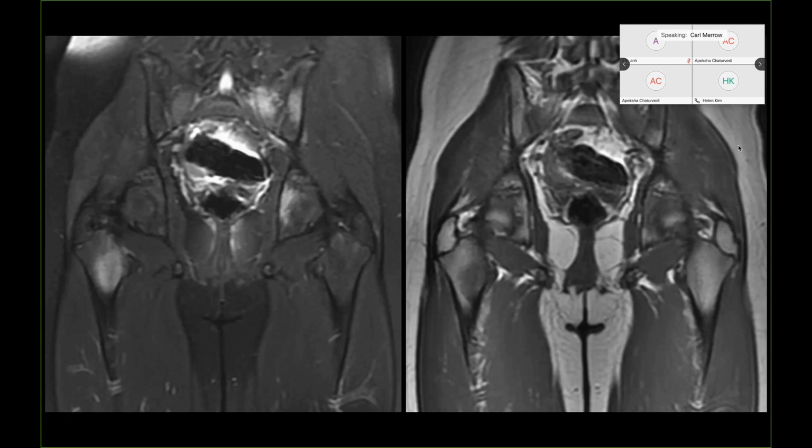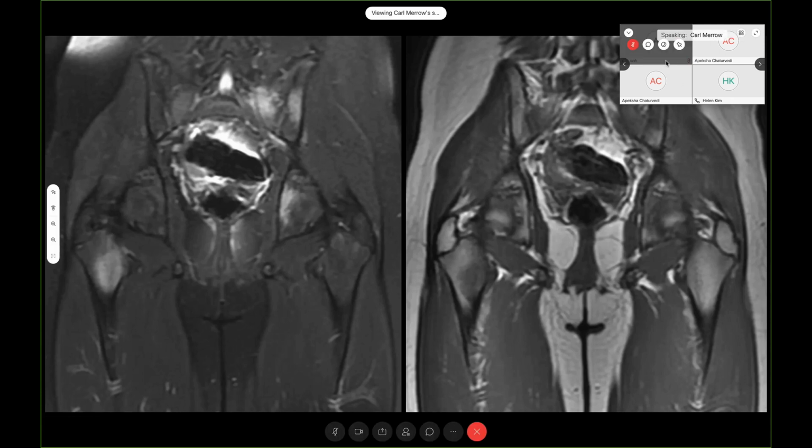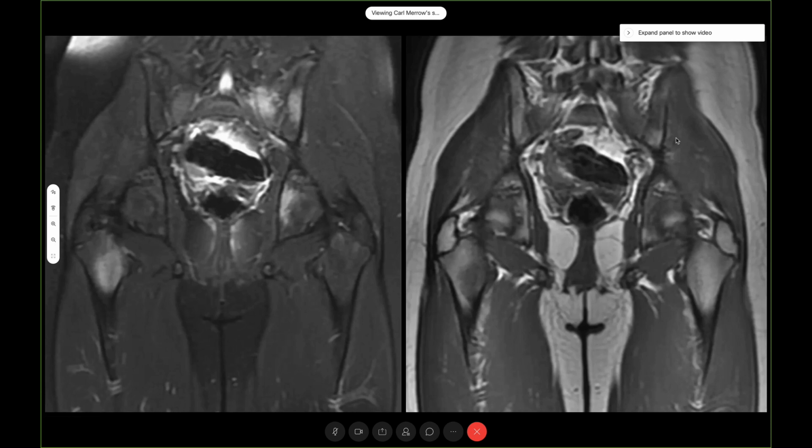Got multiple lesions. I really harped on the fact that the margins are kind of poorly defined, right? Yeah. Because as I think Kieran pointed out in one of his cases, when you see really sharply circumscribed margins between the fat and the lesion on T1, then you're definitely thinking about some sort of tumor or neoplastic process, be it benign or malignant. Right. But when you get more ill-defined margins, you're thinking, is this infectious, inflammatory, post-traumatic, something like that.